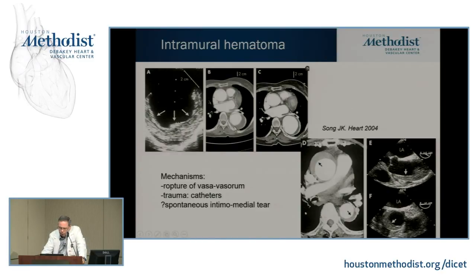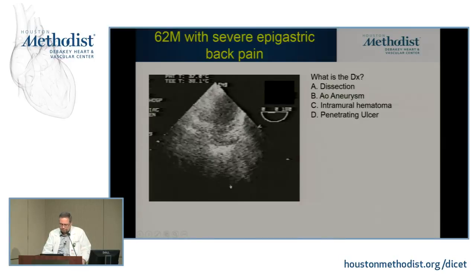Same story. So Faisal showed you beautifully this crescent thickening of the wall, and this is exactly what you see when you do your TEE. So it's the same concept. It's like having LVH. It's like having a piece of muscle there. It's like that crescent thickening around the wall of the aorta. Very similar to what we see.